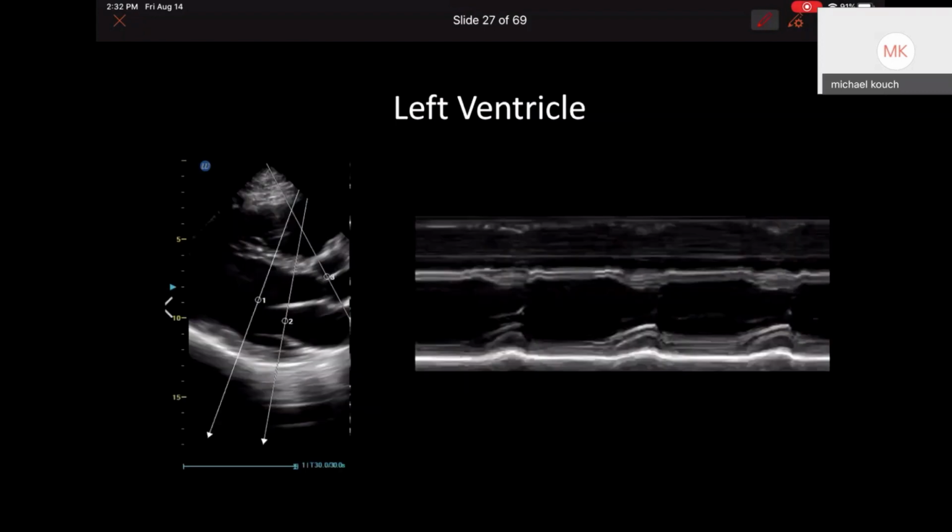Okay. All right. So now let's very quickly go through our left ventricle because this is pretty low yield, to be honest with you, on the boards, right? We have our right ventricle. We have our septum. Okay. We have the chamber of the LV, as you can see on the left-hand side of the screen, and we have our posterior wall here. All right. As the mitral valve, as we have systole, where the actual chamber closes on itself, right? We see a systolic phase. And here, when it's the most wide, we see a diastolic phase. Does that make sense? All right, good.